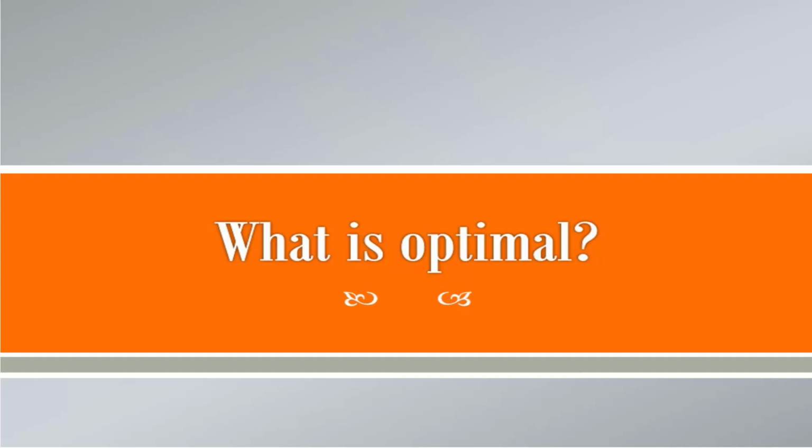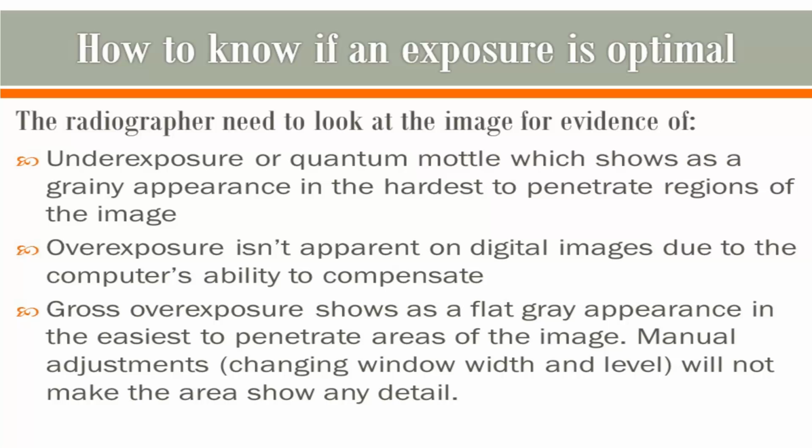In this video, we will learn how to determine if a radiographic image is optimal as far as exposure. In a previous video, our example had an overall exposure that was acceptable, but how can we tell if the exposure was acceptable? And shouldn't we be looking at our exposures to make sure that they're optimal, or the best they can be? So there are indicators we can look for to tell if our exposure was optimal.